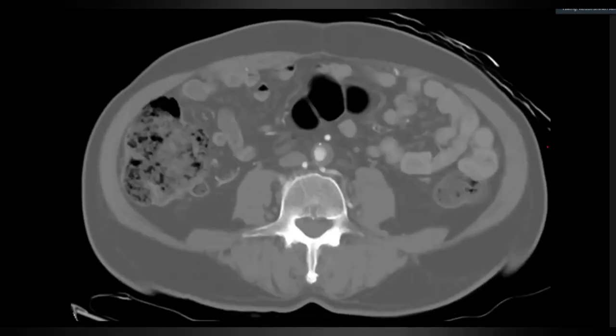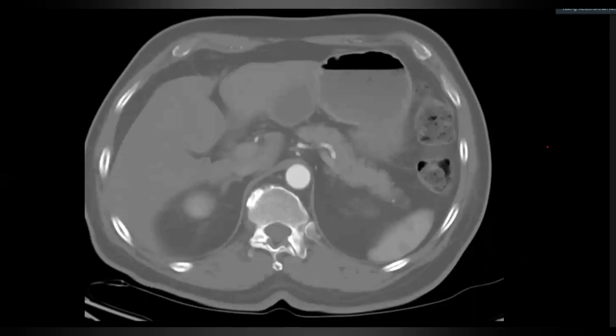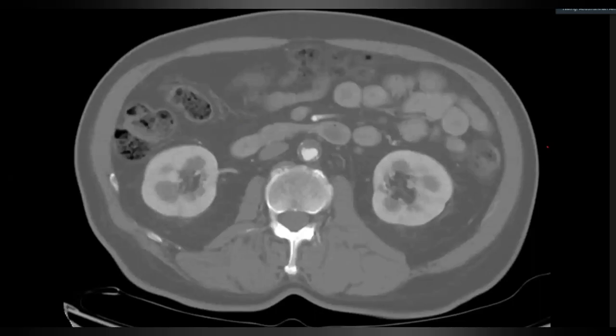Okay, right, all right. I'll go through this with you. So number one, this is not an aneurysm. And again, this comes back to looking at enough of these. If you look at enough of these, you will know that this is a normal caliber of the abdominal aorta. And if you don't believe me, you can measure it. But this is what the normal abdominal aorta looks like. You can see diffuse atherosclerotic disease.